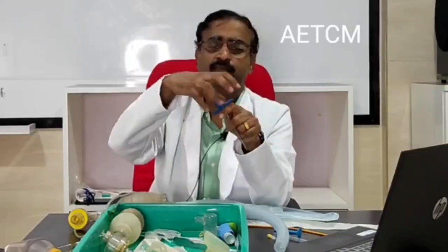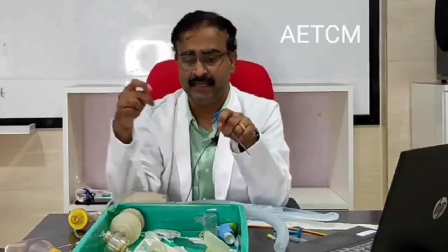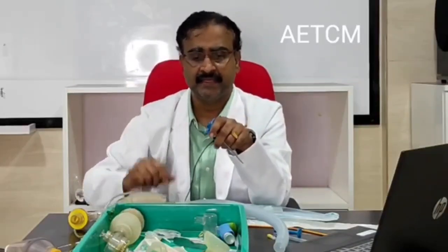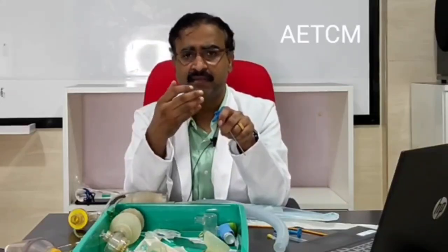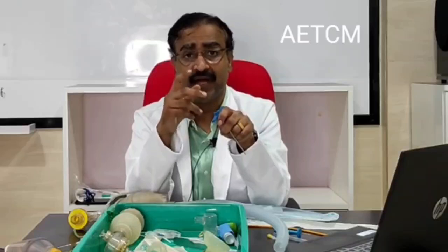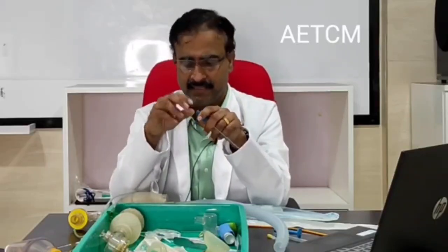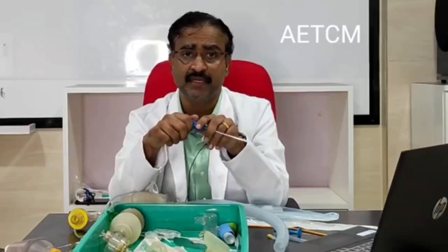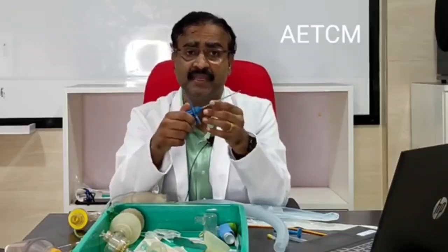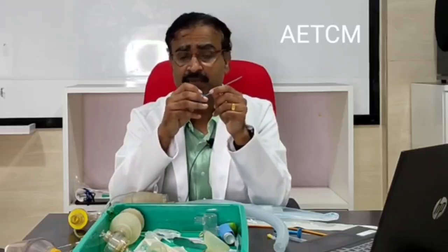The only thing is we remove the cap after it is inserted inside the bone, remove this particular stylet, and here you will attach the IV set and allow fluids, blood products, all sorts of medications to be pushed in until you get the IV peripheral access or maybe a central access in the neck, that is the jugular vein or the subclavian vein. So this is a very, very crucial apparatus, it should be present in every ward, in every ER, in every place where a child is going to be managed.